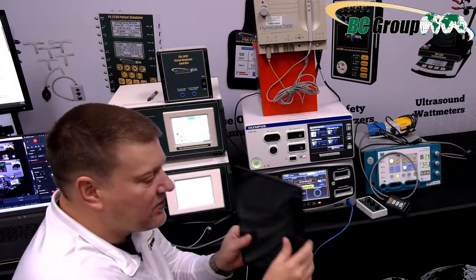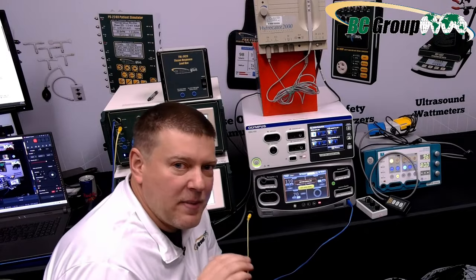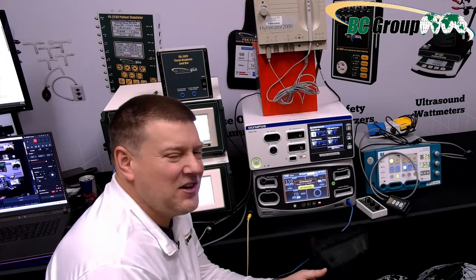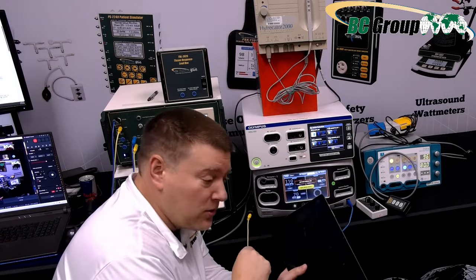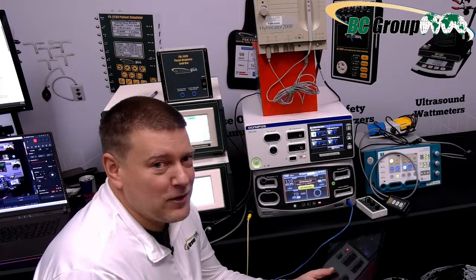I can give the app and one of these tablets to a Biomed 1, and we can have them go out there and run the app, and I can have a Biomed 1 doing defib PMs probably better than most of you, because all they have to do is pay attention to detail, follow the step-by-step prompts, and there are photos that guide them to what buttons they have to press. There are checklists. Guys, software is the way to go for the future.